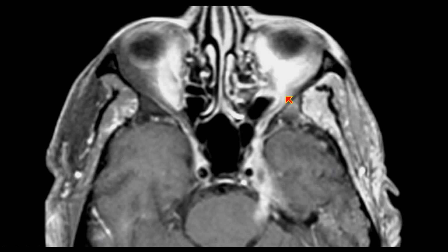If there is perineural tumor spread, as we see in this case, that is going all the way back and touching the pons, that is a very difficult area for the surgeons to palpate. So that's my job to tell them if there is perineural tumor spread going back and touching the pons. Because if that perineural tumor has already invaded the brain, that patient is probably no longer a good surgical candidate.